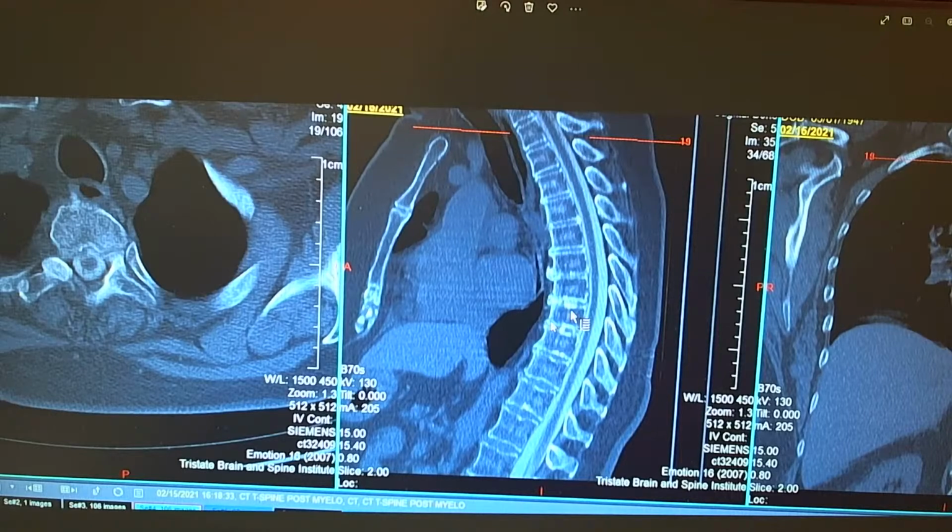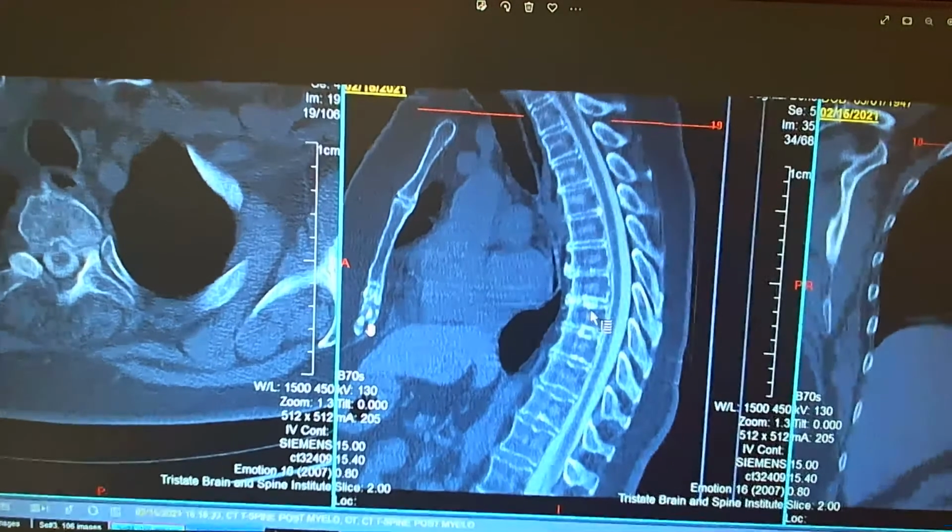Generally, it's extremely unusual to see esophagus. Now, here, what is the structure here? Yes, good one. What is this structure here? In front of the heart. Yes, swallowed. That might be swallowed air. I mean, how else is air going to come there? But I just want you to know that's unusual. Yes, sternum. Unusual to have air there. So this is sternum. Correct.